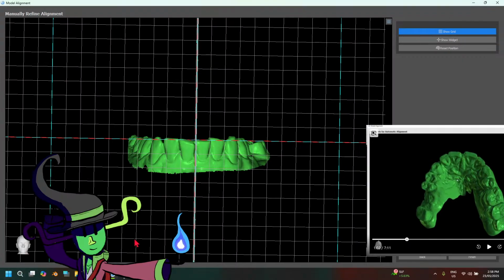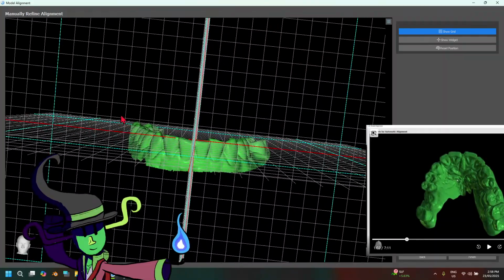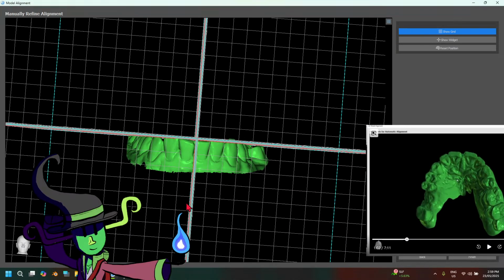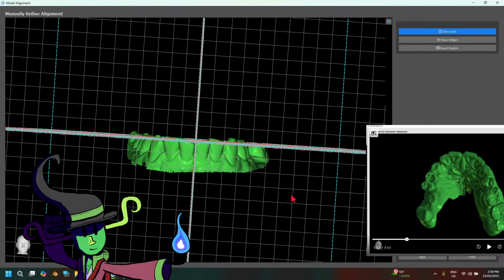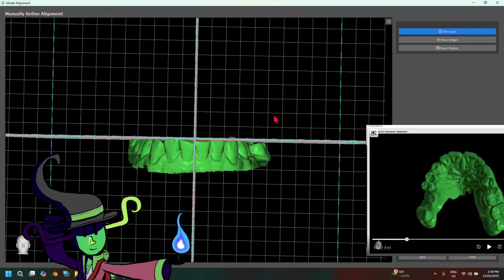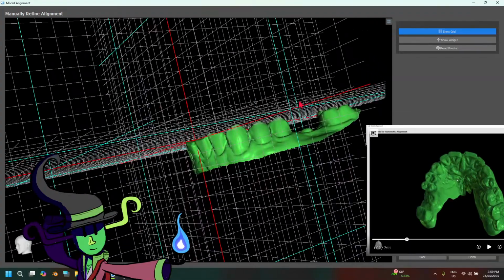I hate the fact that there's no way to lock your view into one specific angle. In Blender, we have this thing wherein if you press some of the numpad buttons on your keyboard, it would give you the ability to face your model right in front of it, and also face your model at the back of it.